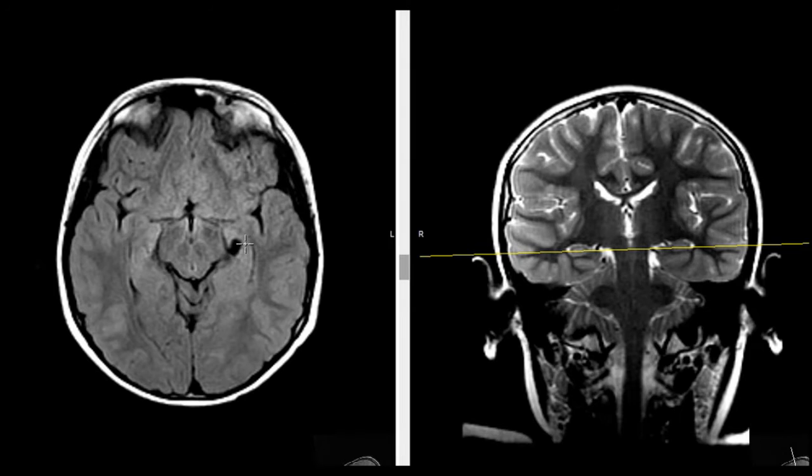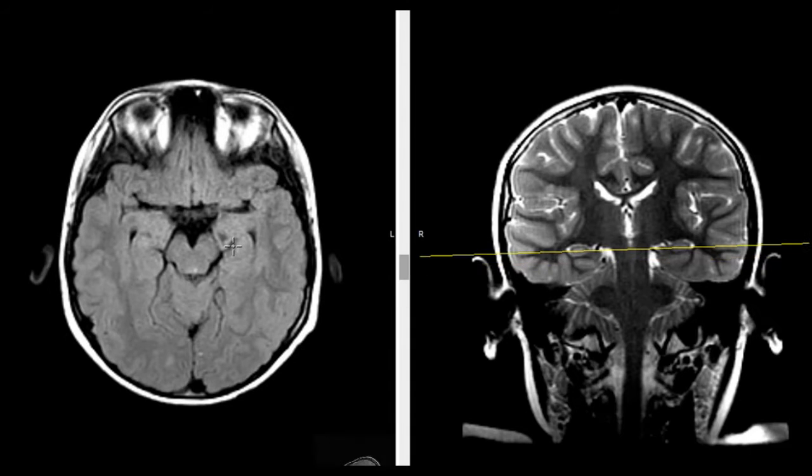And in this patient, they do have a finding. So if we look here on the left side, this is the left mesial temporal lobe where the hippocampal formation is. We see a little round or ovoid area of low signal. On this sequence, fluid looks like this, low in signal, so a small fluid collection.